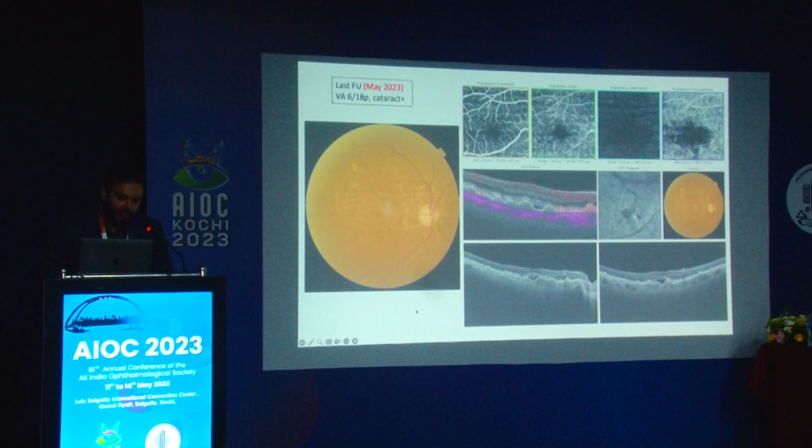So what I basically want to say is that avascular FIPED can still have some fluid, and that is one of the cases in which you might have what looks to be exudation but is non-neovascular. So if you have FIPED, it is avascular on clinical exam, on OCT and on OCTA, and you can't demonstrate a membrane, the subretinal fluid is there, it will remain like that for a long time and does not need treatment, needs observation.